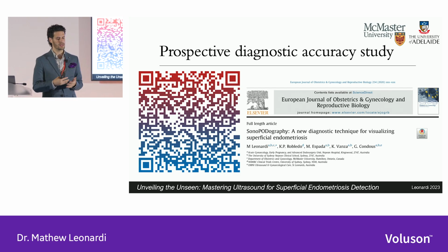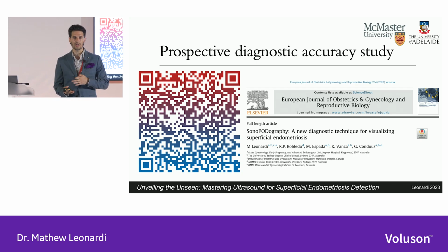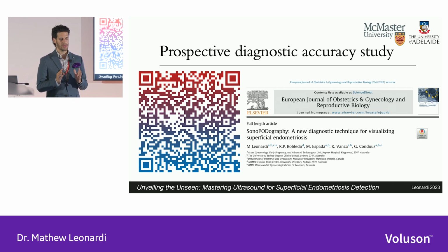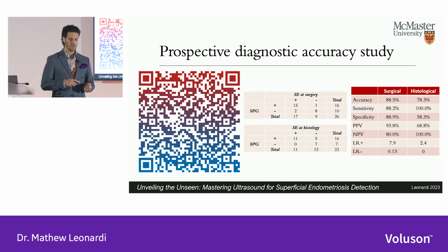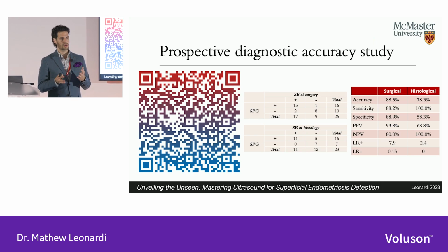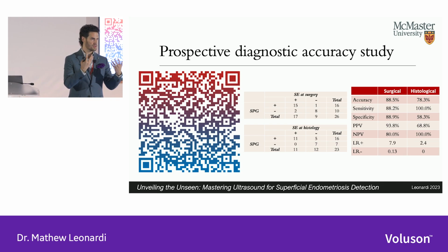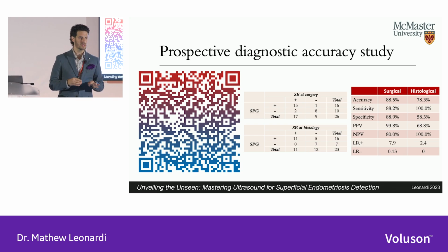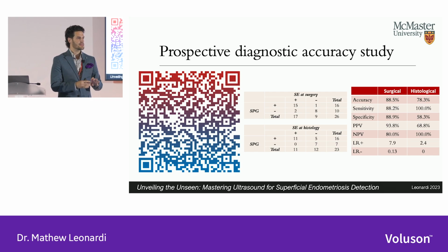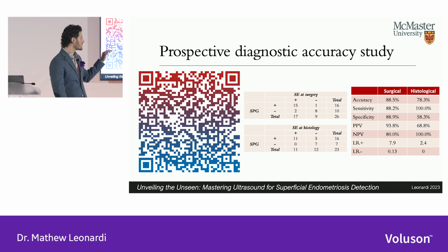There had been, prior to this, some indirect evaluations of adhesions, of thickness of features, but this one we looked for endometriosis, specifically superficial. And what we found, as you can see on the right side, we compared the sonographic views to surgical views, where the surgeon, in this case it was Prof. Condas, evaluated things and said, yes, endometriosis, yes, superficial endometriosis. We also compared it to the histology.